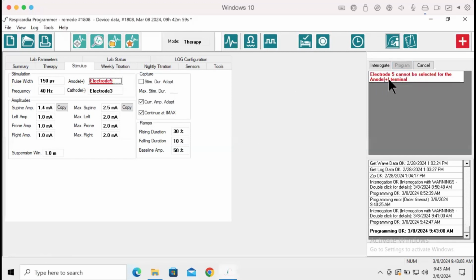Certain combinations of parameter values are restricted, as the combination results in an invalid or undesirable interaction. Such conflicts may not be programmed, and if a conflicting parameter set has been chosen, the conflicting parameter values will be displayed in red text and the program button will become inactive.